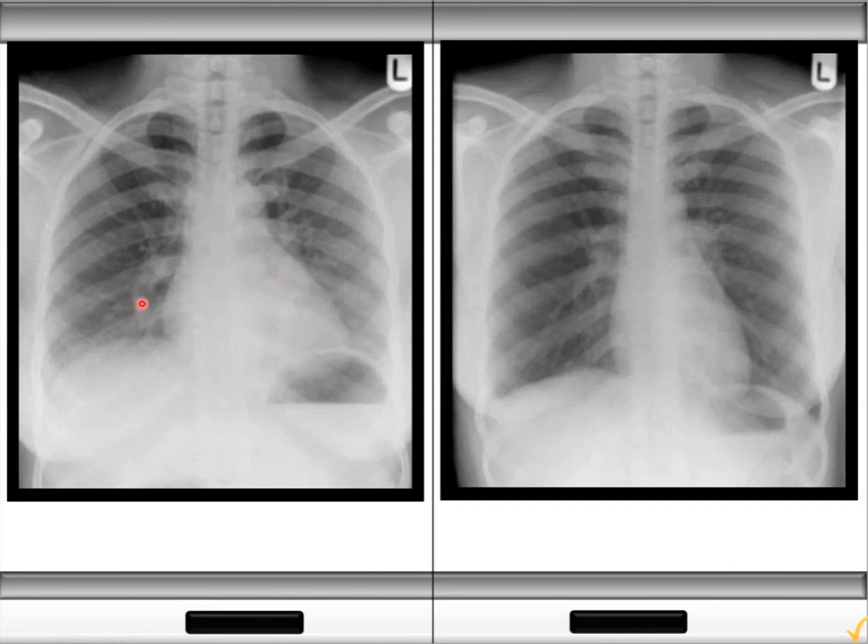So you check 6 anterior ribs. The anterior ribs are these guys in the front. It's a circle, so the ones that are kind of upward towards the center, that's your anteriors. 1, 2, 3, 4, 5, maybe 6. But my posteriors are when they come around. It's the same ribs, but see how they come around the back? That's posterior. So I have 1, 2, 3, 4, 5. I only have 6 posterior ribs. I don't have a good inspiration.